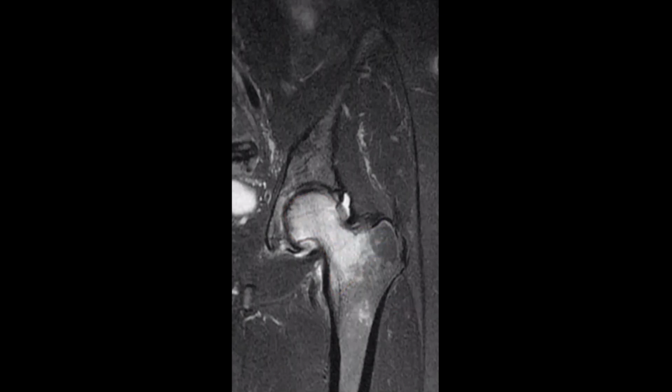This one is very important because sometimes the classic treatment for this case is corticosteroid therapy. So please be sure that you can differentiate between avascular necrosis and transient osteoporosis of the hip, because in avascular necrosis of the femoral head, the cause can be corticosteroid, while in case of idiopathic transient osteoporosis of the hip, as you see here in this case, corticosteroid can be one of the tools to treat this case. So this point is so important in your reporting.